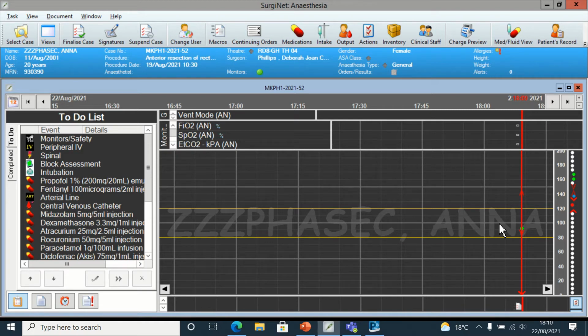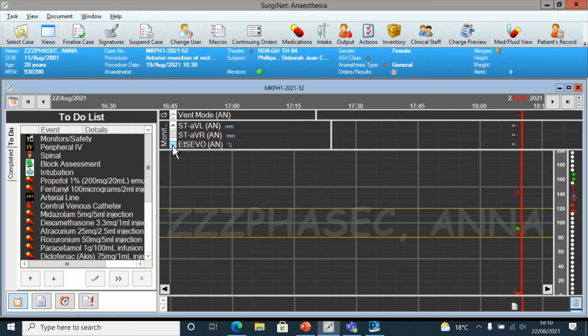And you remember that the GA majors macro has more monitoring. If you see here in the monitoring box and scroll down, you'll see it's got monitors like LiDCO and blood gas and BM, so there are some extra monitorings in here. You can enter them here, but it's easier to enter them using the document button. I'll show you in a minute.